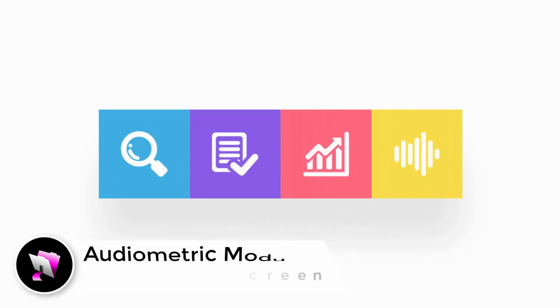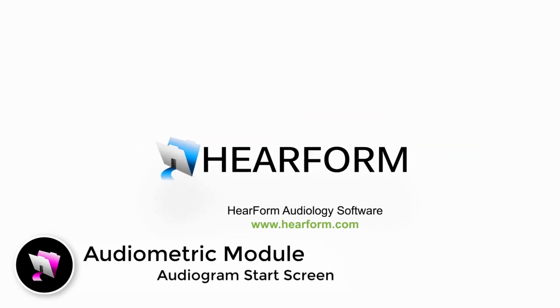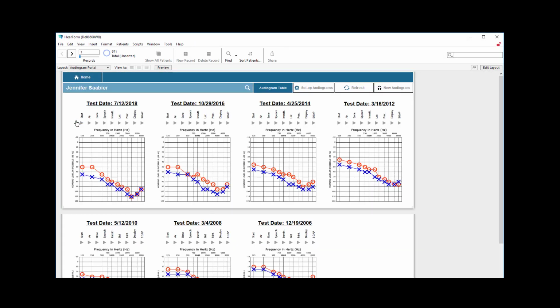Welcome back. This video will provide an overview of the Audiogram Start screen in HearForm Pro. From the HearForm home screen, I'm going to click the Audiology button here.